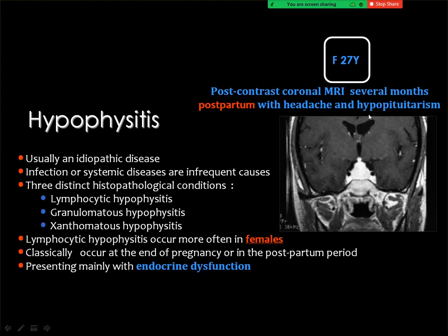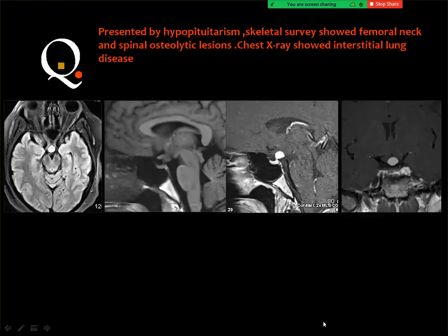Then you got headache and hypopituitarism. And if you see this particular history, adult female, recent delivery, and postpartum hypopituitarism, you think of lymphocytic hypophysitis.